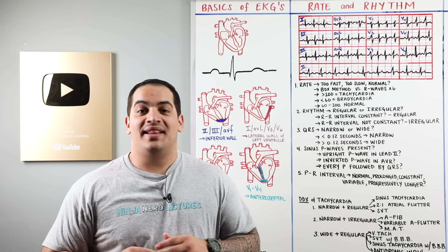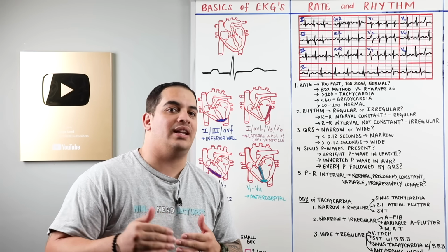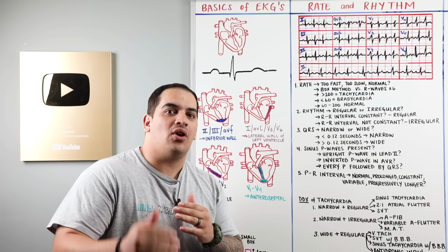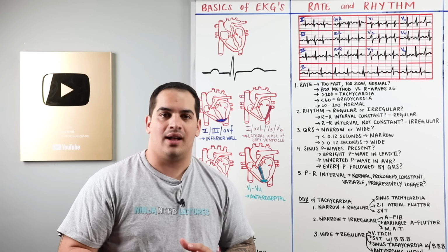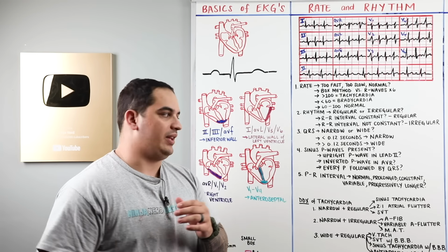What's up, Ninja Nerds? In this video, we're going to talk about how to systematically approach a 12-lead EKG and have a master interpretation of it. Before we start that though, let's start talking about the basics of EKG, the foundational concepts that you need to have in order to effectively and efficiently read 12-lead EKGs.